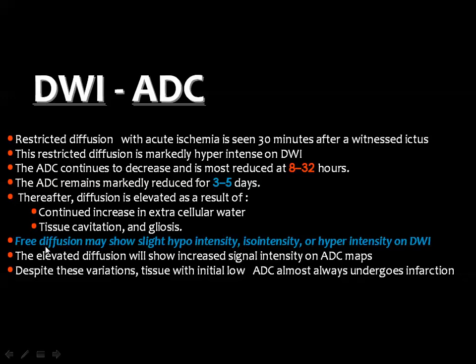Then free diffusion may show a slight hypointensity on DWI, isointensity, or hyperintensity, and in this situation the T2 shines through.